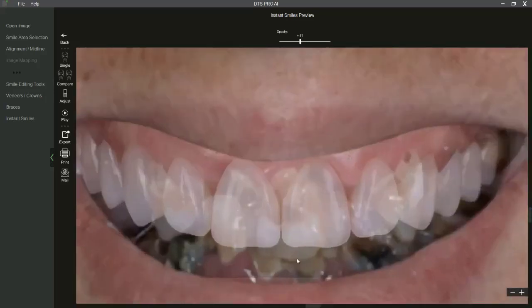All right. So turning the transparency down, I can see I've taken off maybe 1 millimeter from our incisal edge. My midline should be right here on about that right third of the tooth. Canines need to be widened out on both sides and brought up. All right. That gives me all the information I need now to go and do this in 3D.